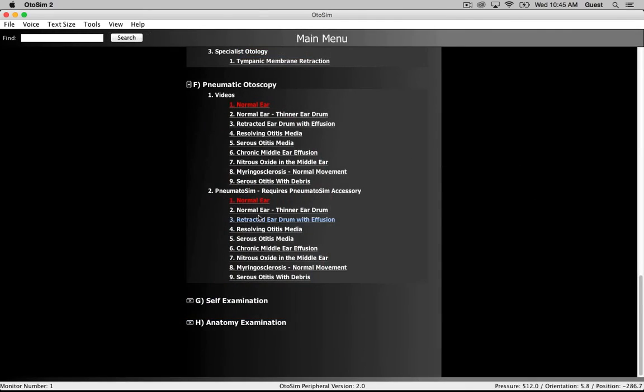What we've added in OtoSim 2 are two very important functions, we believe: the self-examination portion and the anatomical quiz section. In the self-examination, we have a bank of over 250 questions, and we have a standard quiz and a comprehensive quiz.